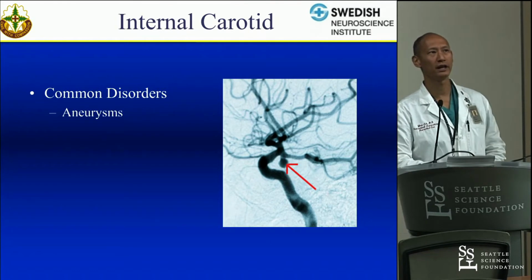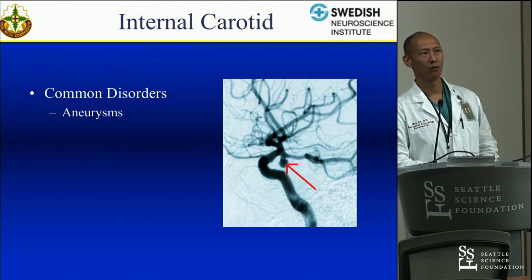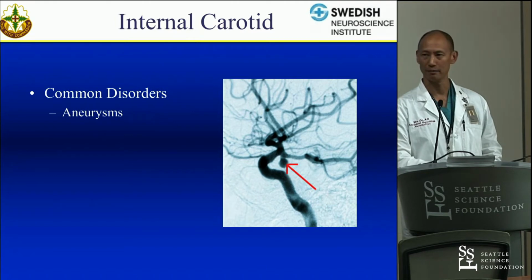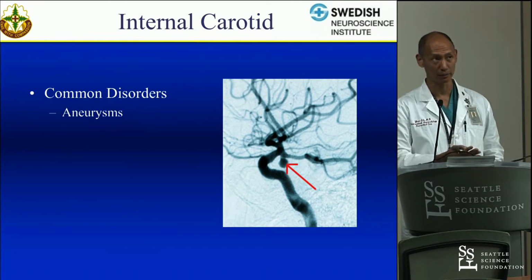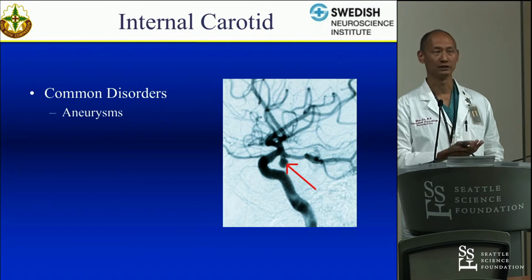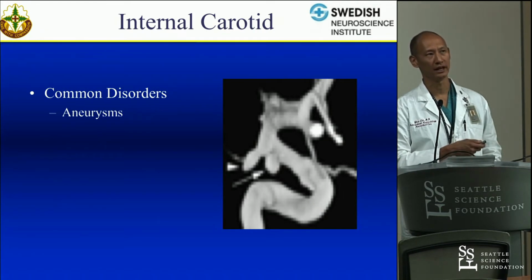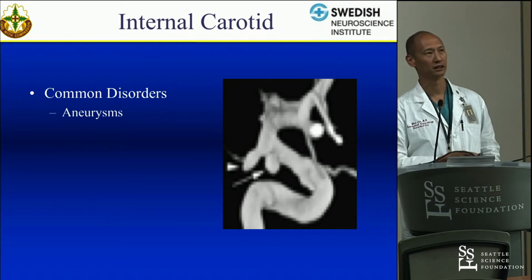Here's a posterior communicating aneurysm. They probably have a similar morphology to the ophthalmics that I mentioned. Either the communicating is completely separate, or it arises from the base, or it actually is incorporated into the aneurysm itself. Here's a good picture of a patient with both a posterior communicating and an anterior choroidal. You can see those two actually lie very, very close to each other.